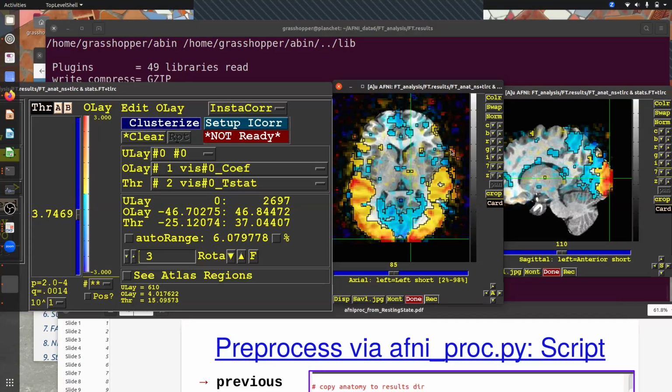Maybe. Am I worried here? Probably not so much. Even seeing stuff outside the brain, that's probably not too problematic, because we're looking at blood oxygenation response, and near draining veins, or even near skull that's near the brain, sometimes you'll see that signal appear in places you might not expect it, in an expanded range, because we basically have slightly magnetized fluids going through a magnetic field. Kind of odd things can happen a little bit.